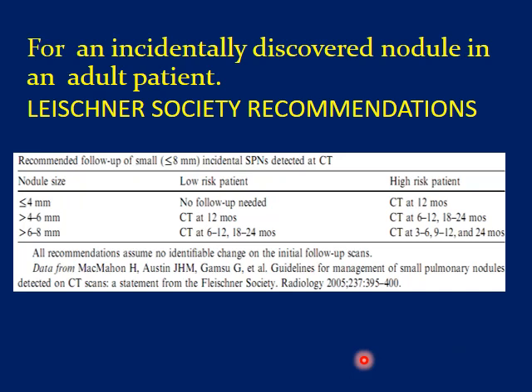Because of the high resolution of CT now, we see a lot of micronodules that we used not to see in the old days of single slice CT. This makes a problem for us, especially as we see these nodules in patients with known cancer, breast or something like this. So, it is wise for small nodules, less than 8 millimeters, to follow this table.